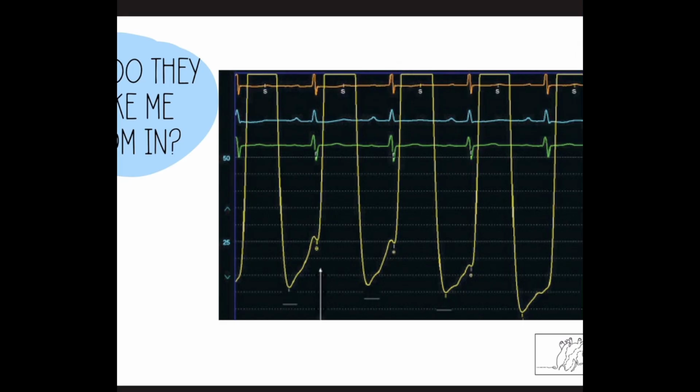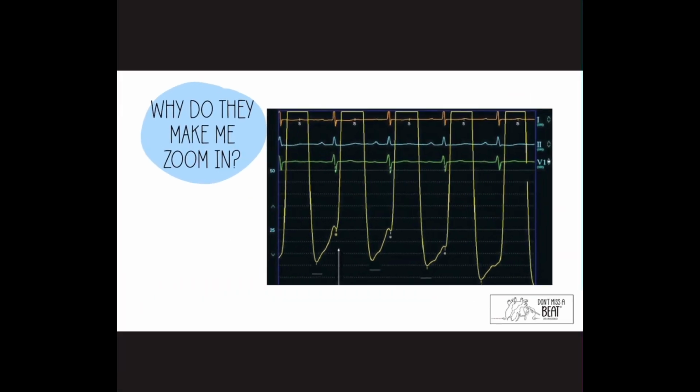So let's say it was marking EDP all the way up here, and it was marking off of the S wave instead. Well, that's going to read me an EDP in the 40s. That's telling me my patient has really end-stage heart failure and is really struggling with compliance. But in reality, their EDP is all the way down here, just the computer sometimes measures incorrectly, and you're smarter than the computer. So it's always good to double check when the screen comes up.